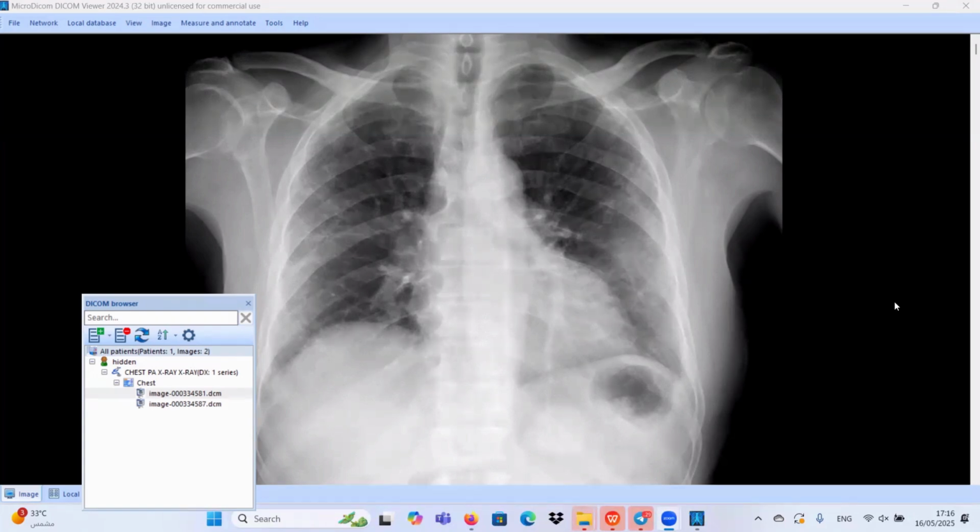There are some irregularities around the margin, some end plate depressions and bony degenerative changes. Also, in the subcarinal region, posteriorly, there are some erosions along the lateral margins of the vertebral body. No, ignore this one.